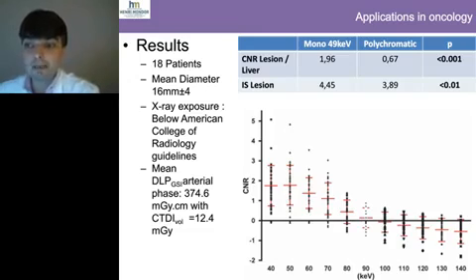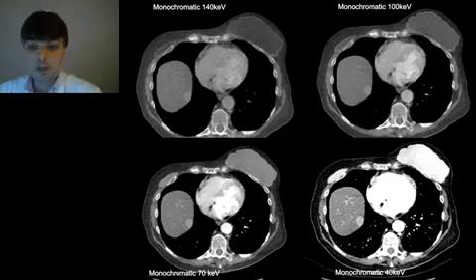And this is to illustrate that same acquisition, different reconstruction of the patient with HCC, and the optimized monochromatic level close to 49 keV here, which shows the highest contrast to noise ratio. Again, an optimized energy level based on the clinical situation.